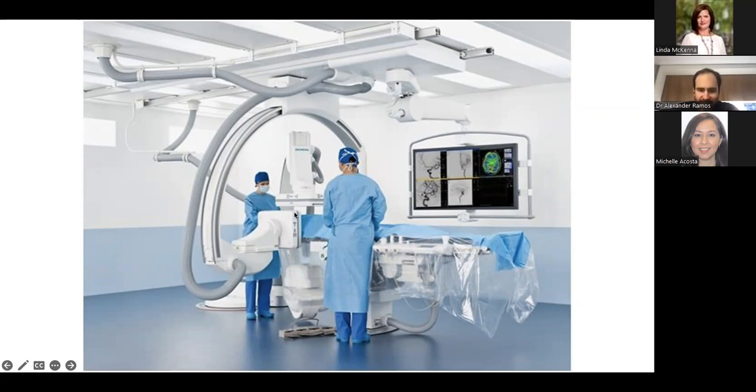There's one X-ray detector lateral and one AP, on top of the patient's head, and you take the pictures at the same time. That's what biplane means: you're shooting both a lateral and an AP X-ray simultaneously. The operator stands at the patient's groin, roughly here, or their wrist, roughly here, and we watch on the TV screen as we shoot the angiograms.